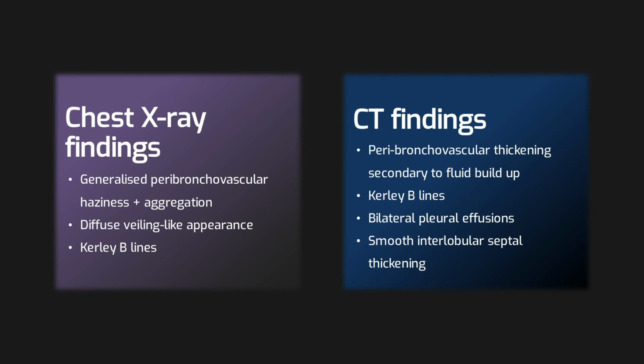In summary, these are some of the typical features of cardiogenic pulmonary edema as seen on a chest X-ray and CT.